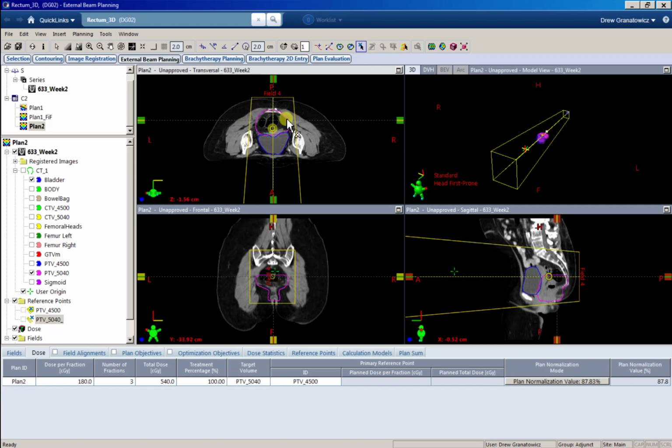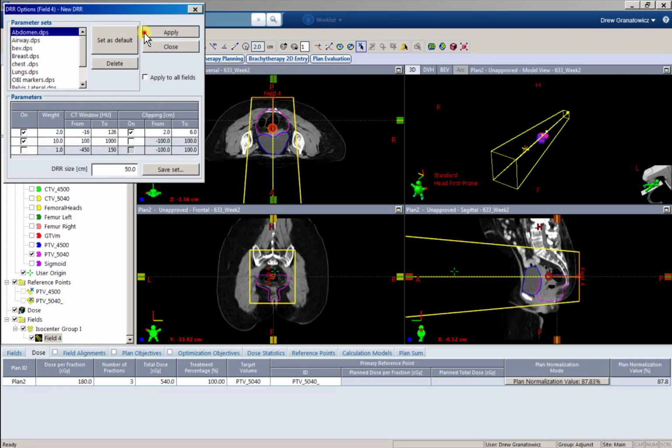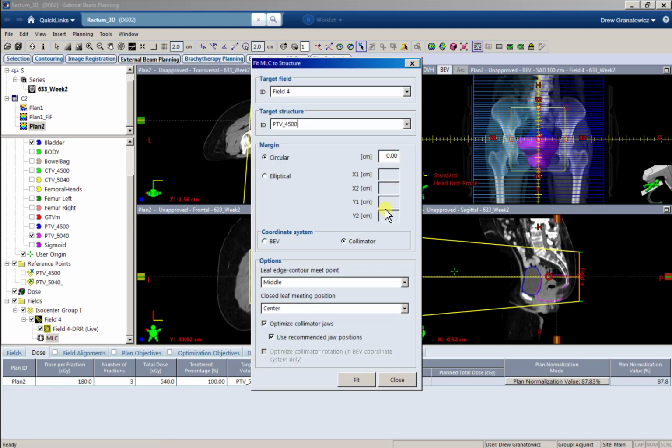Okay, so now we don't have a physical location. This point is now virtual. So we can change it here and use it as our dose tracking point, primary reference point. So our prescription is new for the boost. Our target volume is our boost volume. Our point is for our boost volume. Let's add our beams in here. We need our margin to be around our boost volume.